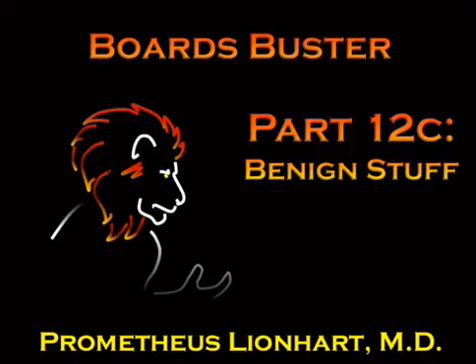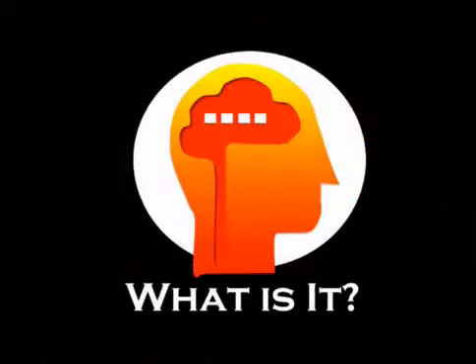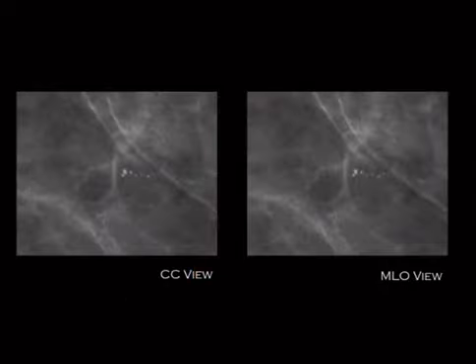Okay, so this is our lecture on benign entities within the breast. Just like in other talks, three basic types of questions. So here's our first case. This is a calx case, and we've got both CC and MLO views. If you remember from the prior talk, you would want to use actual magnification views when you're evaluating calcifications.